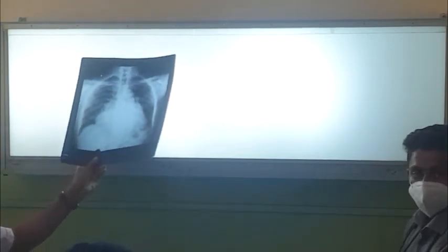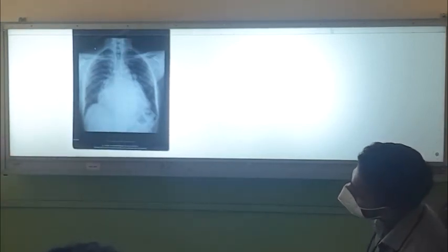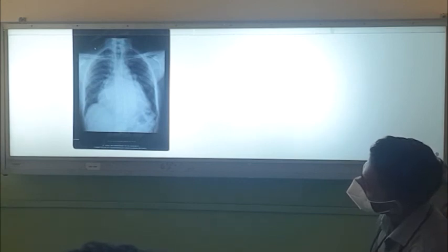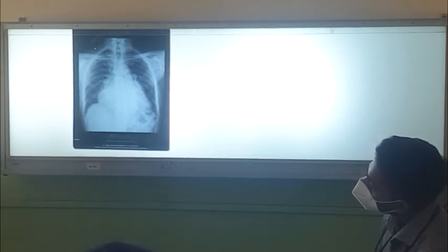And then this patient came to me this Monday. But you saw this, you saw this. What is this? Can you see this? It's 22nd Monday. That is it.